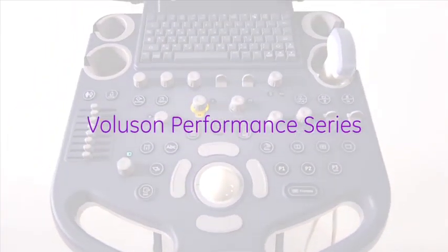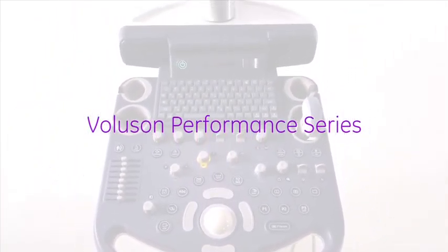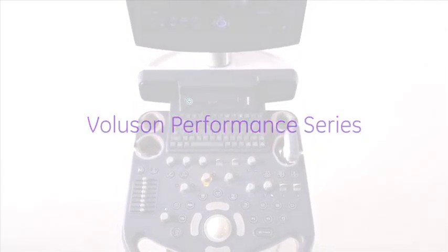The Voluson Performance Series is an easy-to-use system with excellent image quality and performance to help meet the needs of your practice.